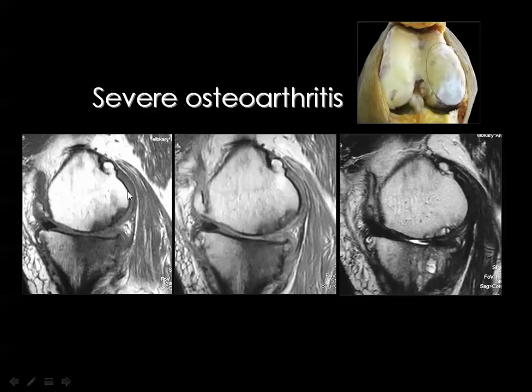And here you can see this is the articular cartilage of the femoral condyle, which has been totally lost here, and the result is the development of multiple subarticular pseudocystic changes, which are common in severe cases of osteoarthritis. Also, you can appreciate the prominent osteophytes. You can also see the bone marrow edema of the articulating surfaces. Here you can see in the tibia more than in the femur.